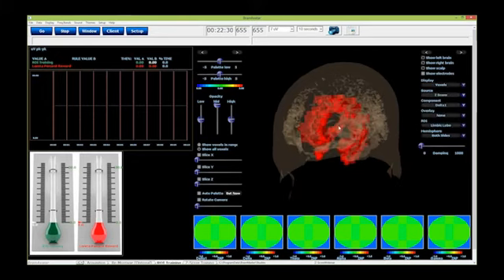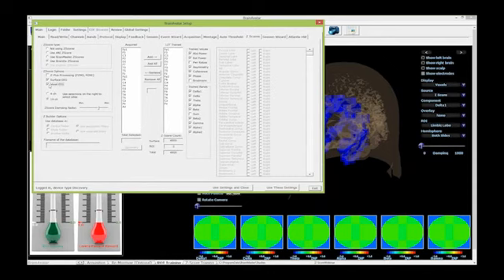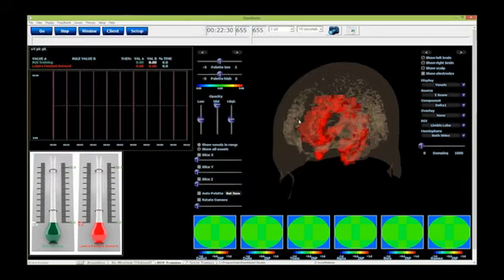Now, before this is fully going to work, you need to make sure that you are allowing Voxel EEG to come in. You don't need to go to Brodmann and you don't need to turn on anything like that, but you need to make sure Voxel EEG is checked on. If Voxel EEG is checked on, then you're able to look at the Z-score data coming in, and you actually aren't training the Voxel EEG sLORETA. You're still training the amplitude. The event wizard tells it what you're going to train. You're just basically giving it the tools in the other portions to basically train with it.